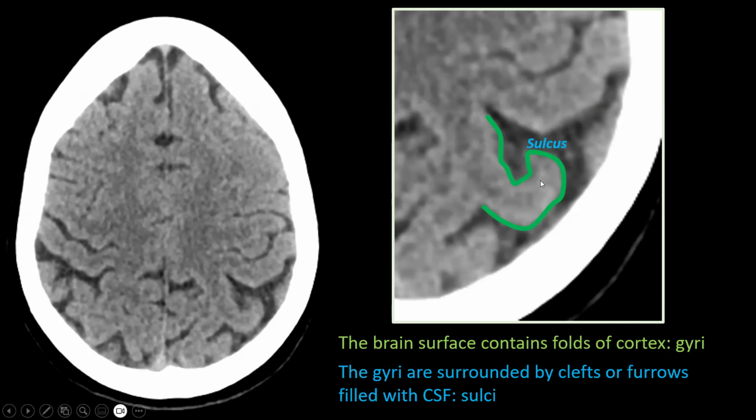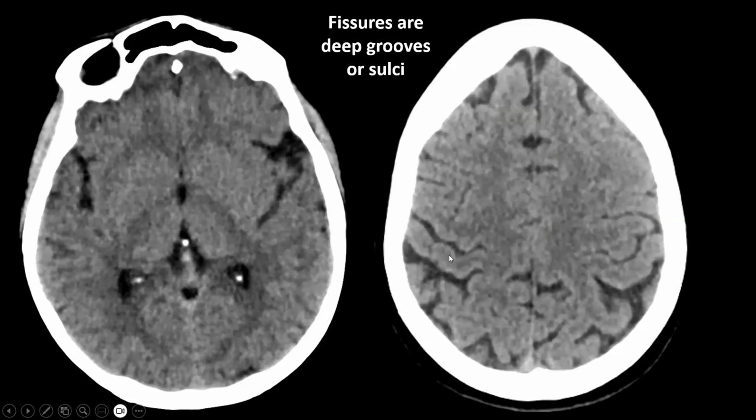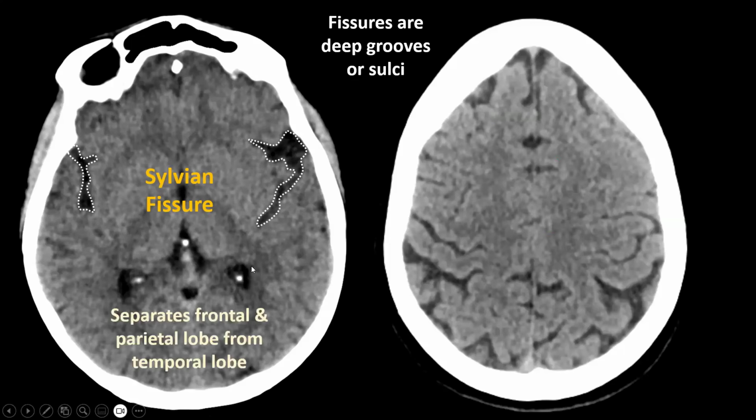These folds or ridges are called gyri, and sulci are clefts or furrows filled with cerebrospinal fluid surrounding the gyri. If we have very deep or important sulci, we call those fissures. And there are two fissures you should definitely know. The first one would be the Sylvian fissure, and the Sylvian fissure can be seen over here. It is the fissure separating the frontal and the parietal lobe from the temporal lobe. And over here we find the insular cortex underneath the Sylvian fissure.